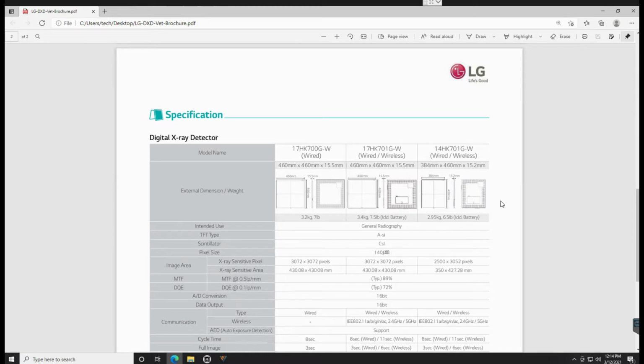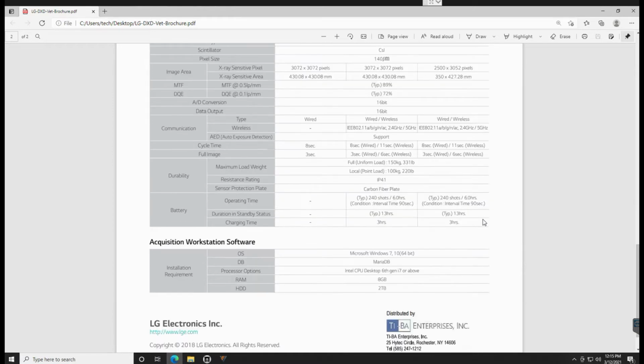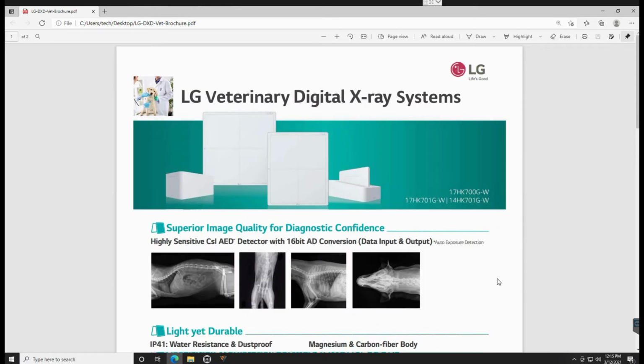It's going to be wired, which means it's always got power, and you don't have to worry about taking it out of the table. It's considered to be like a semi-permanent installation. No worries about batteries or damages or drops or liquids or anything getting on it, because it's going to be installed under your table, and that's where it'll sit for the life of it. So what we're going to do is show you the software that runs it.